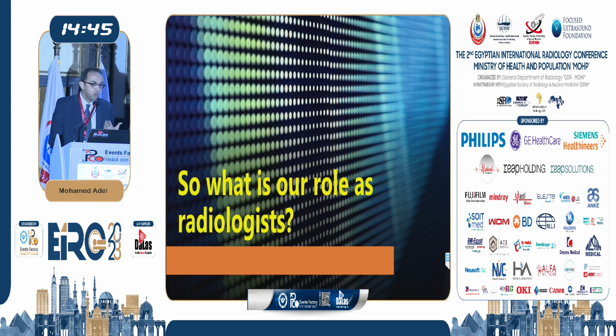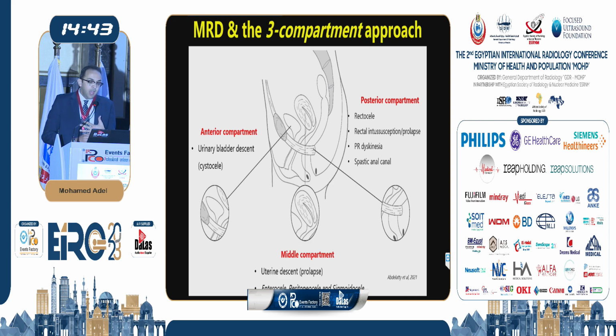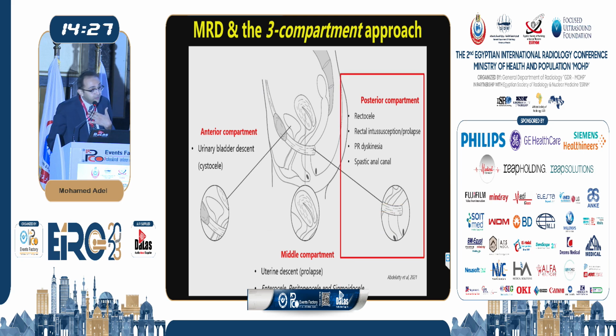So what is our role as radiologists? As Dr. Rania referred and as Dr. Abdurrabbu mentioned, when we do an MR defecography and MRI pelvic floor, we have to have a wider approach. We have to look at the pelvic floor as consisting of 3 compartments. It's not just the posterior compartment. I know I'm more focused on the posterior compartment today, but we have to comment on everything. We have to be aware of the pathologies that happen in the anterior compartment, middle compartment, and posterior compartment.